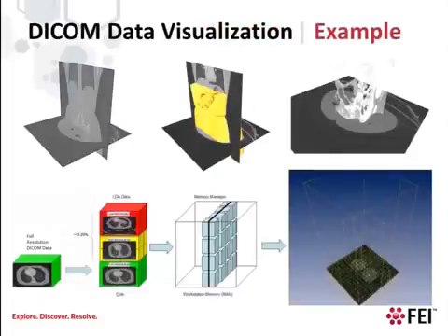To quickly develop a prototype application for rendering a medical dataset, we will use Open Inventor's Volume Viz extension. Volume Viz provides both data management and rich interactive visualization of complex volume datasets. Different representations include volume rendering, axial and arbitrary slices, isosurfaces, and embedded 3D geometry. These can all be combined into a single Open Inventor-based application.